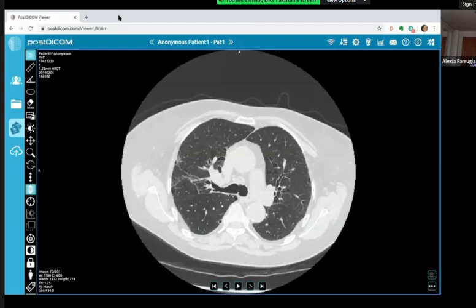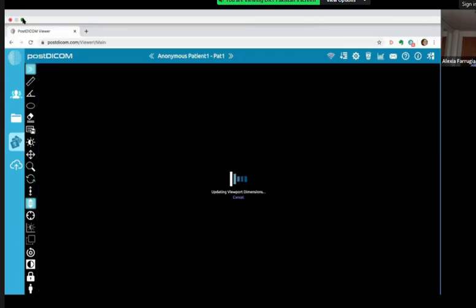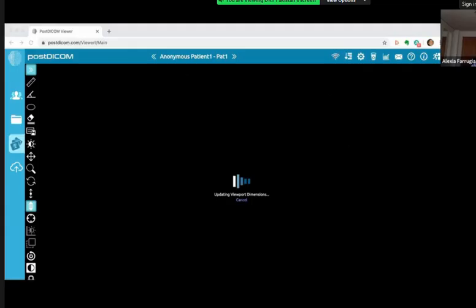I will show you. Let me revert to the PowerPoint. Okay. So this lady had lymphocytic interstitial pneumonia. So she had a cystic pattern of these thin wall cysts, some centrilobular nodules, some ground glass, but the predominant pattern is cysts, multiple cysts, and some septal and bronchovascular thickening.